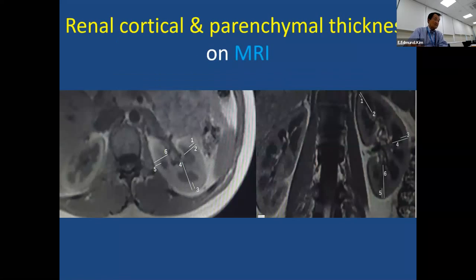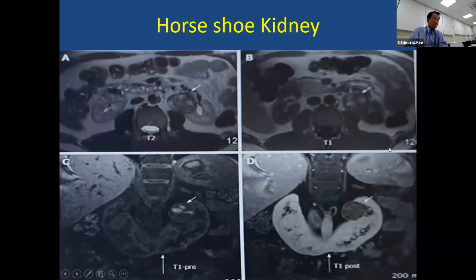So sometimes we see this kind of anomalous kidney. And with MRI without contrast, you can also demonstrate the cortical medullary junction and the collecting systems easily. You can see a connection here very well on T1, and a post-contrast gadolinium study delineates the cortex and medulla connected.